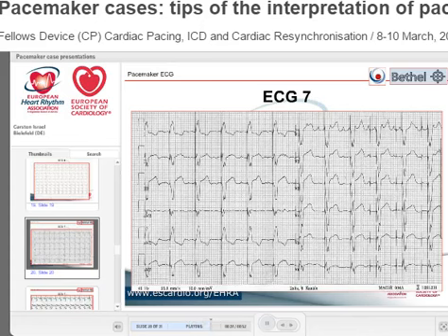It looks like undersensing. Here on the right side, you see in V1 nice big flutter or fibrillation waves, and still there's atrial pacing. So, undersensing of atrial fibrillation. That would be boring. I show you the marker, and here is the atrial flutter or fibrillation rather. And you see hundreds of markers. Every single fibrillation wave has been sensed. And even the device says it is in automatic mode switch, AMS.